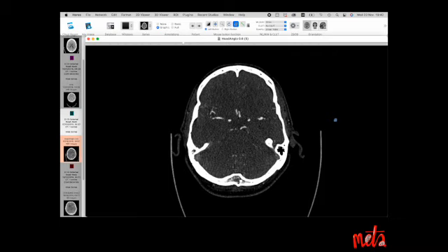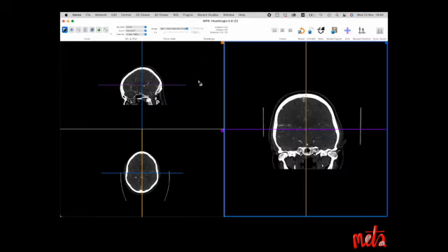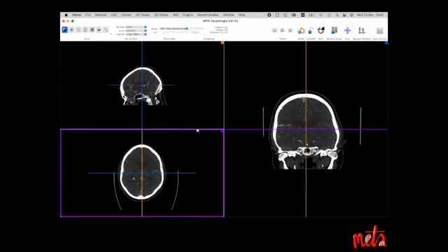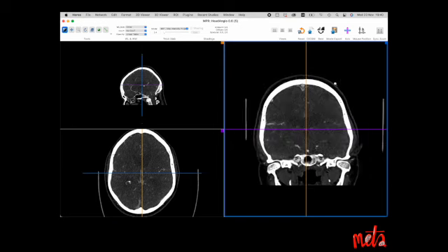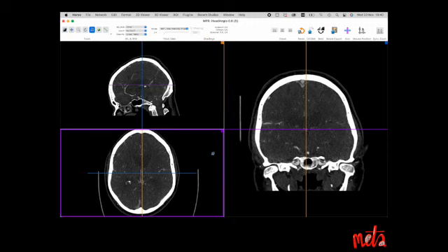How we do this is by taking the thinnest slice available on your study. For either CT or an MRA, this will typically be a 1 mm slice, and we're going to put it into the multiplanar reformat, or the MPR function, as you can see here, which every PACS monitor has. So how are we going to measure our aneurysms?